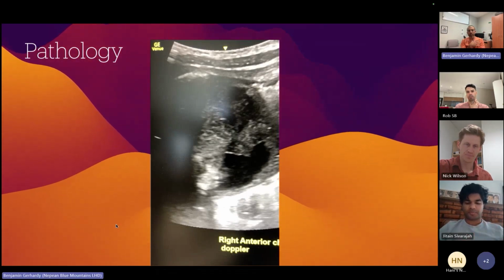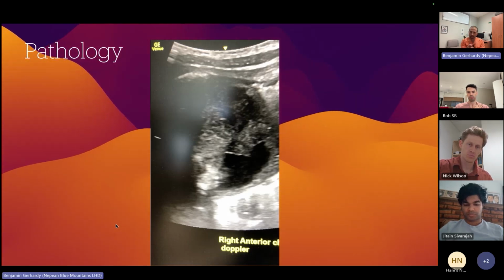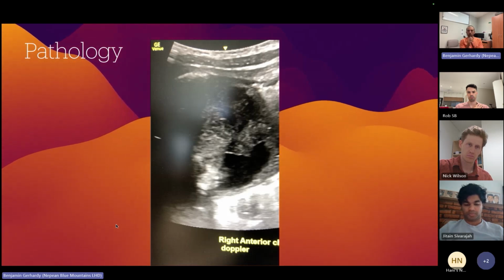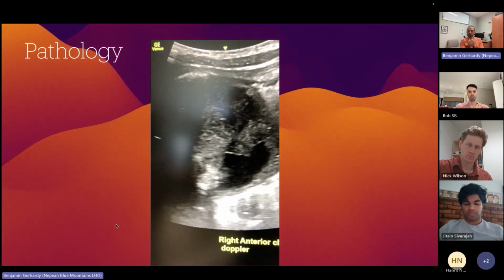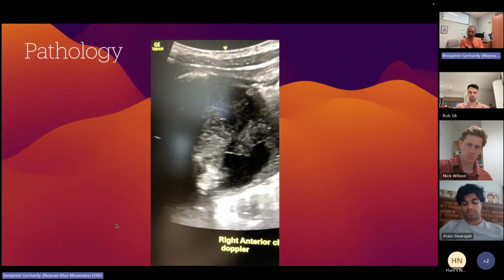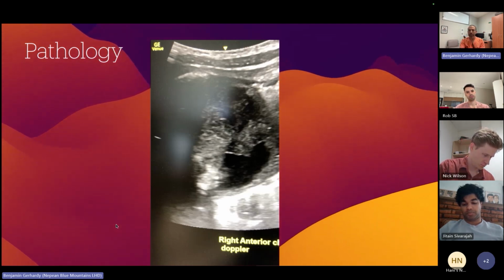She had infective symptoms and a mass, or what looked like infection on her chest x-ray, but when you have a look at it with ultrasound, you see this well circumscribed lesion that had vessels all going through it. We did a percutaneous biopsy with a TruCut needle, and it was breast cancer. In her mid-20s, right? Looked infected, history of infection, didn't get much better after antibiotics. On a chest x-ray it just looks like a big round consolidation, right? But it's not. So you can find some funny things sometimes.